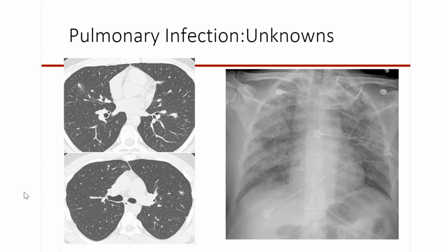So what about the one on the right, all right? Multifocal consolidations, reticulonodular opacities, right? It's very busy. There's a lot of nodules here. Again, the heart's not enlarged, there's no pleural effusion. This is multifocal pneumonia, possibly of atypical etiologies. So both these patients, these are two different patients, had parasites, all right?